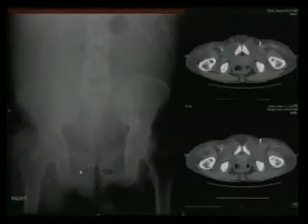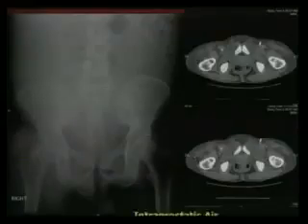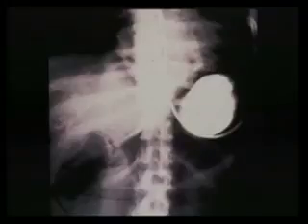Do you see this gas? Where's this gas located? It's not rectum. Rectum would never look like that. Look at the CT. It's in the prostate. So is this an infected prostate with a gas-producing organism, or could this be a TURP? Could it be a TURP? Sorry, Dr. KUB, I drew a blank, had a brain fart.